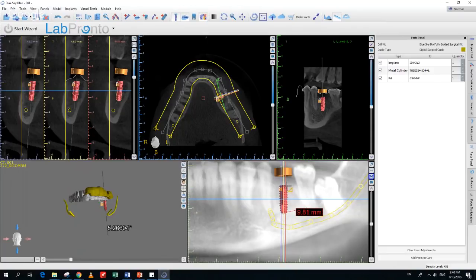An additional measurement, you just click again and click again. When you're done, click on the same button in the horizontal toolbar to turn off the measurement tool. You could grab and drag the actual measurement if it's blocking any sort of visibility, just to move it out of the way. You could also grab and drag the endpoints of the measurement if you want to fine tune the position or measure to something else, and you could see that the measurement gets updated automatically.